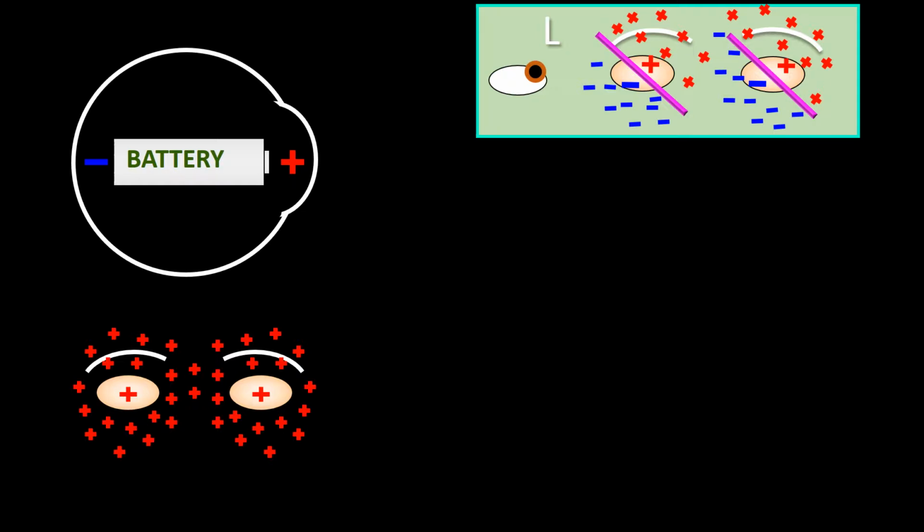Each has a clear line of delineation, but this time the line is oblique, producing a positive field up and laterally on the left side, but on the right, creating a positivity up and a negativity laterally.